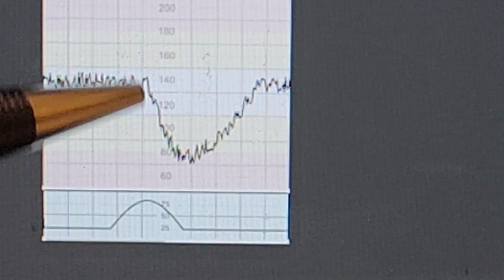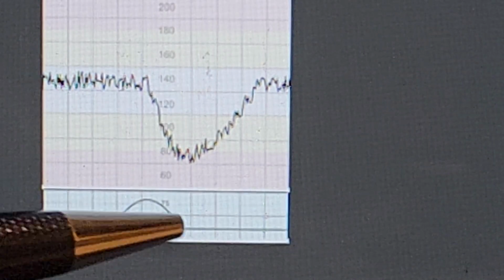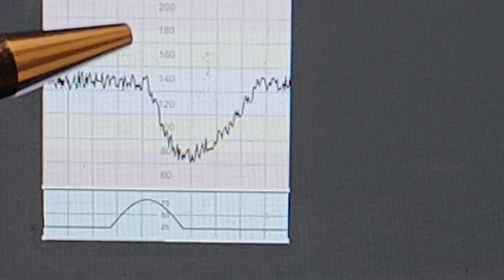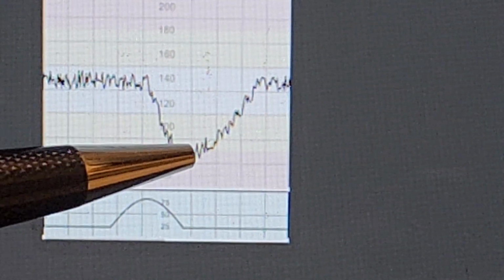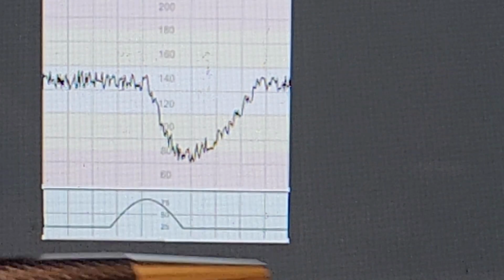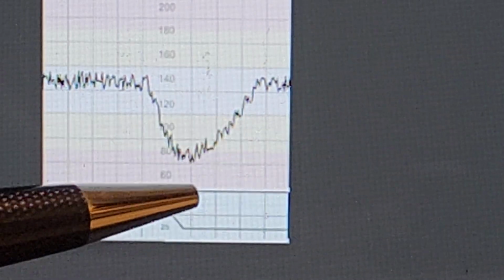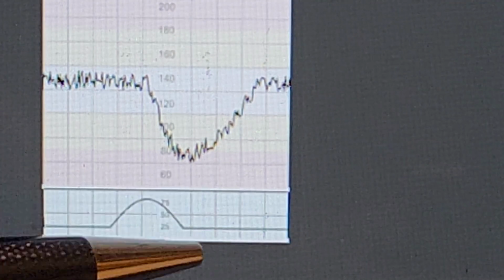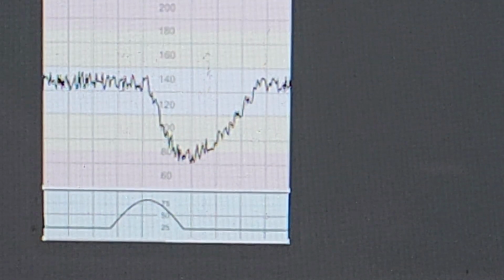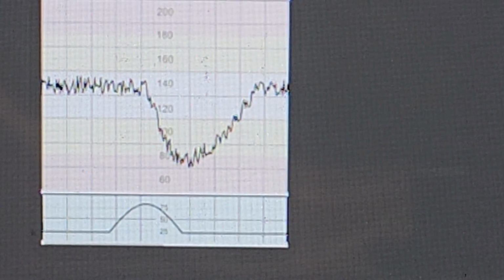The contractions will be, let's say, for 10 seconds or 15 seconds. So the oxygenation of the baby will be enough for, let's say, 2-3 seconds, and then the baby will start decelerating. And then what happens after the recovery of the contraction? The baby starts to ventilate again through the uteroplacental perfusion, and there will be some more oxygenation. It takes some time till the baby gets some oxygenation, and then starts to accelerate again. So this is reflecting uteroplacental insufficiency, and this is a serious type.